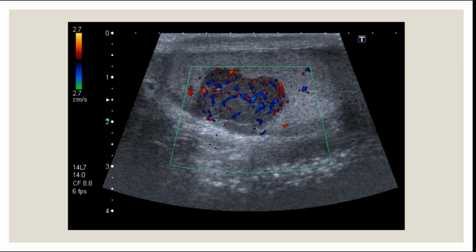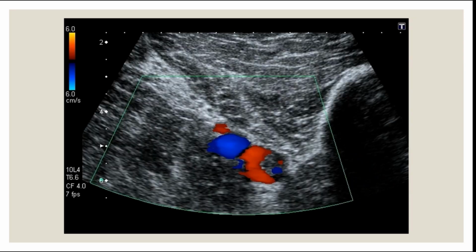And the last one should be a bit easy. If anyone can just guess, you don't have to even describe it. You can guess the diagnosis. It's fine. Because okay, we know ultrasound, Doppler, but we can see something on the ultrasound.